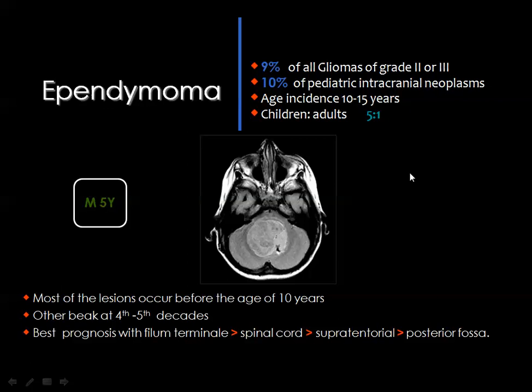And this tumor is located in the region of the fourth ventricle, and commonly you will see a mass in the midline posterior fossa region centered to the region of the fourth ventricle. And this mass will show the criteria of the tumor being an enhancing lesion, and it may contain calcium, and it may show some vessels within the tumor.